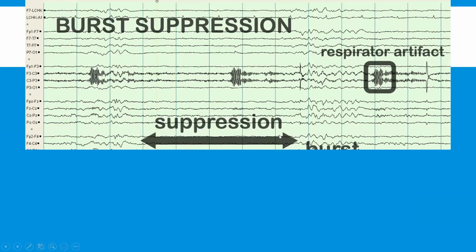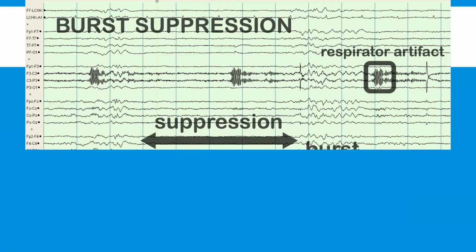Okay. All right. So I don't know why it's a little bit off the midline. While I was looking at these, it should have been more midline. So this is a brain that's even more slow. This is a person whose brain has something called burst suppression. Burst suppression is exactly what it sounds like. There are these bursts of brain activity, and then it's totally flat for, look, here it looks like 1, 2, 3, 4 seconds, right? And then you have another burst, and you have a slowing.